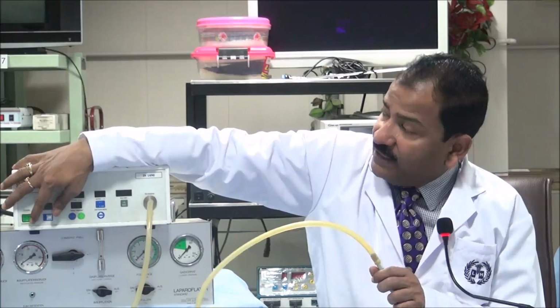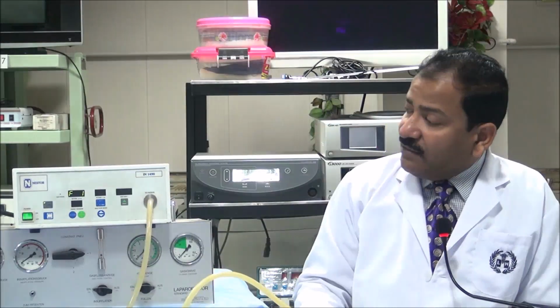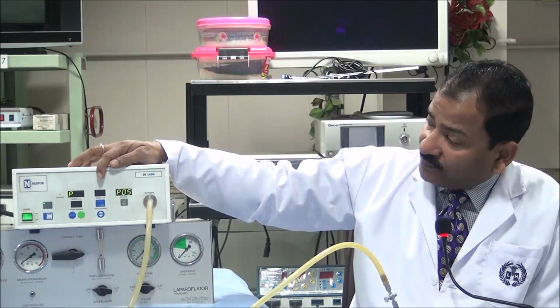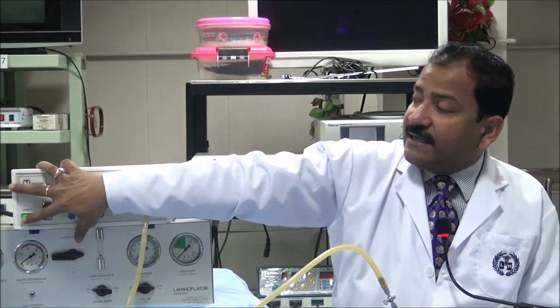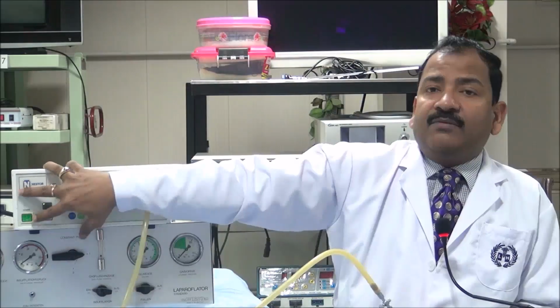Here this is the insufflator and I will switch it on. You will see very typically that as soon as the insufflator is attached, it will give you some error here. This is the mistake which we have done, and it will lock. I have to switch it off and switch it on again.